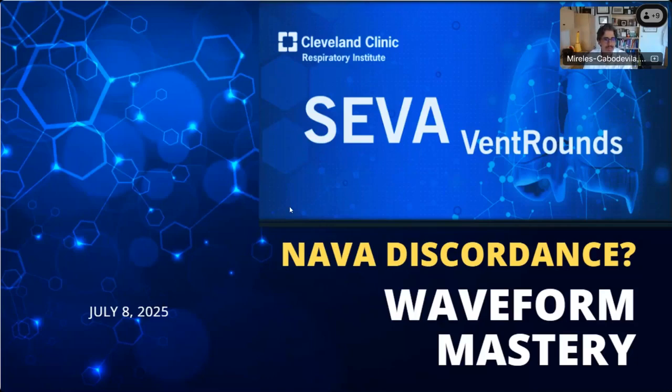Good afternoon, everybody. Welcome to SEVA VentRounds. Today is July 8th, 2025. And today we're going to present a case in which the question is NAVA discordance. And it's more about taking a look at the waveforms and trying to understand where they come from. So this helps put things into context.